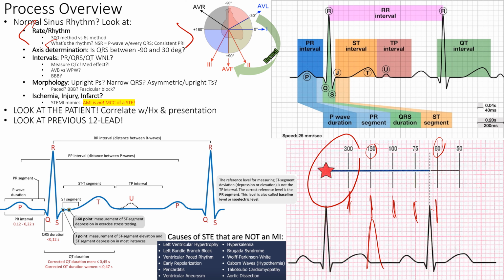That's where we use all of our arrhythmia interpretation skills to figure out what rhythm it is. Is it a first degree block? Do they have ectopy? Do they have VTach? Do they have AFib RVR? Do they have SVT? We'll touch base on this in our next lecture when we talk about arrhythmias and more advanced arrhythmia recognition. But what is the actual rhythm? Is the QRS prolonged? Is the QT prolonged? Those are things we'll talk about next time.